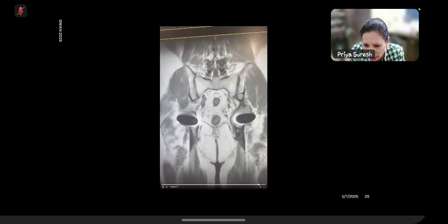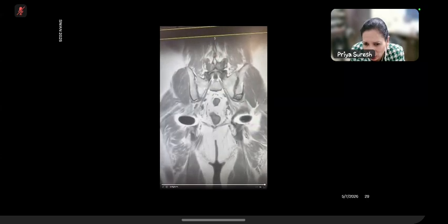So, and into the ischium. So it's quite a lot of lysis. And can you see here? See, and it shows very nicely. The T1 shows the demarcated osteolysis and the normal marrow. It shows very clearly the change in the bones.